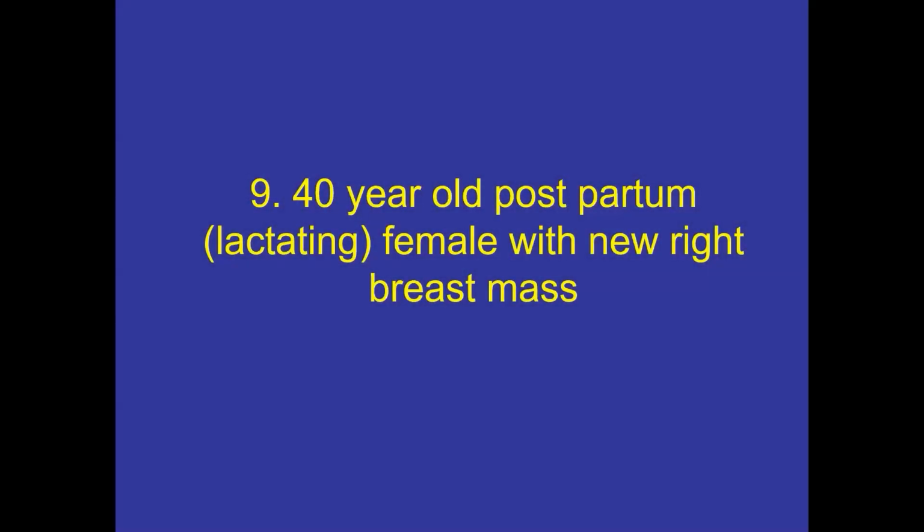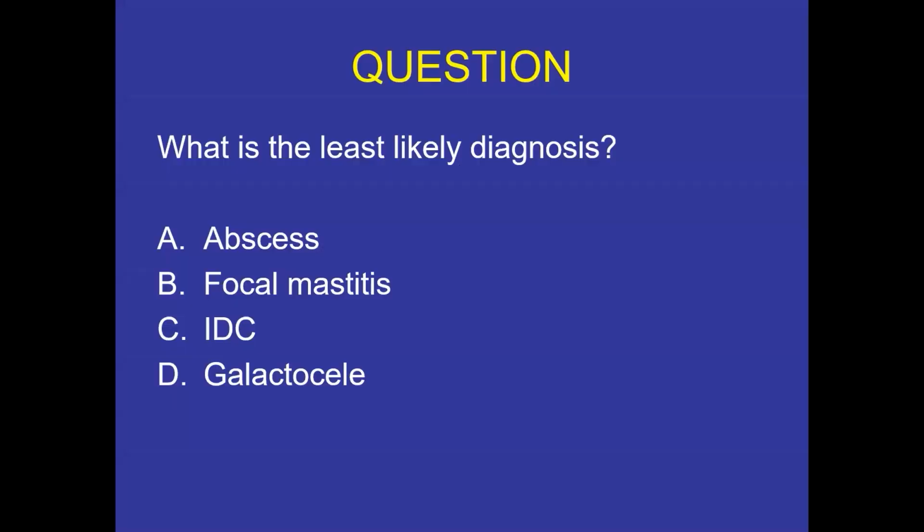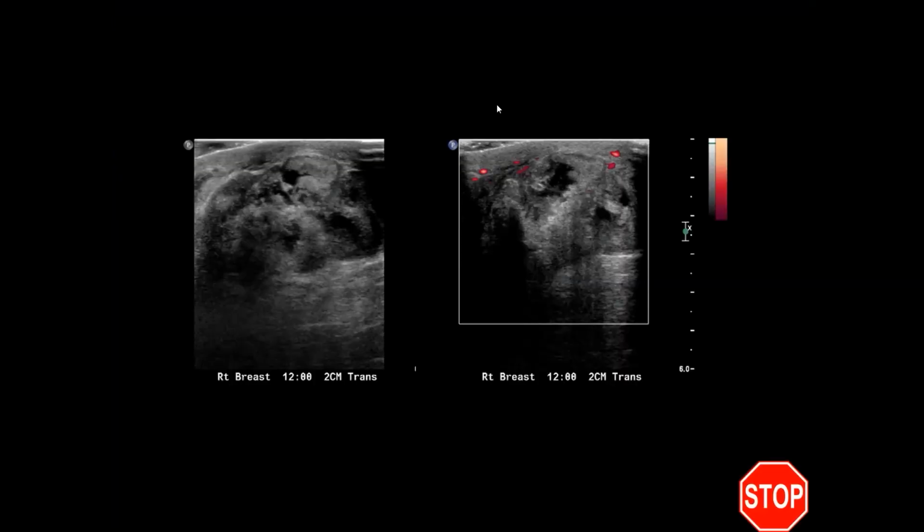So now we have a 40-year-old postpartum, note she is lactating, female with a new right breast mass. All right, go to the question. So what is the least likely diagnosis from the answers? And I'll go back and I'll move this over so that everyone can see.